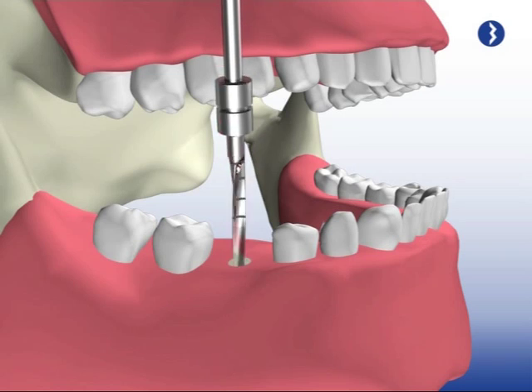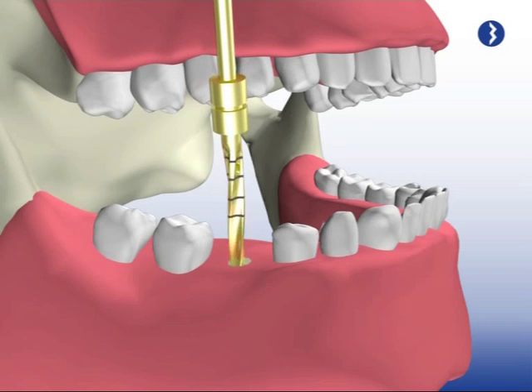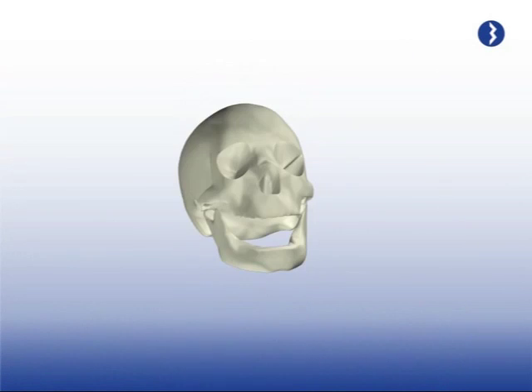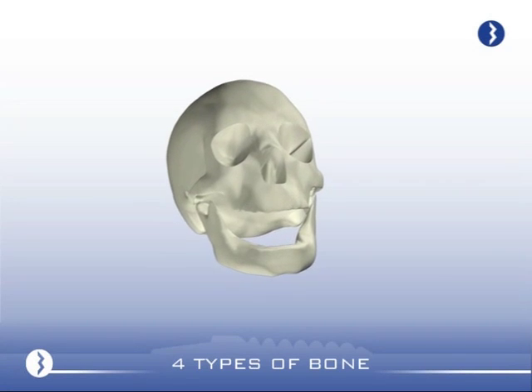Inadequate temperature control during drilling or excessive pressure would cause a osseous fracture and undesirable osseous reabsorption. The Trinon system should be followed by its design: simple drilling sequence, implants, and according to the type of bone involved. Remember the 4 types of bone and the quality of osseous and their anatomic order in the jawbone.